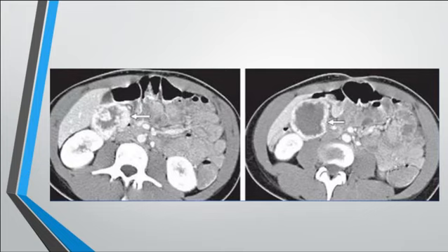Okay, I'll give you a hint. This is the second part of the duodenum. This lesion is in the second part of the duodenum for localization purposes. Describe. What do you see? This is a large lobulated, thick-walled lesion. Seems to be a necrotic center. Fluid in the center. So there's a large lobulated lesion with a necrotic center seen in the second part of the duodenum.